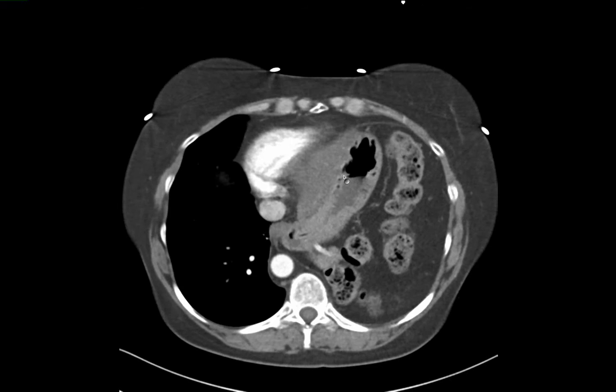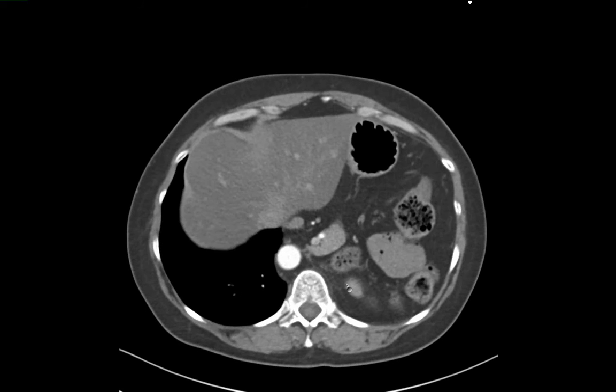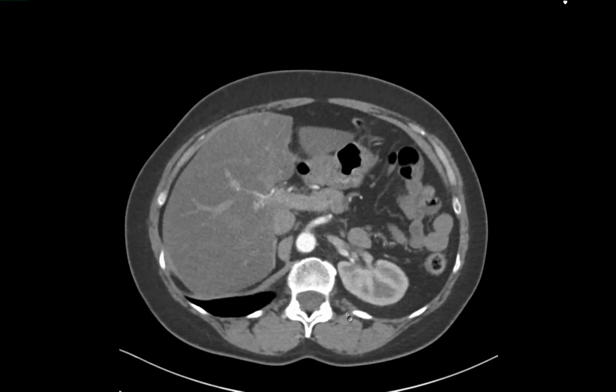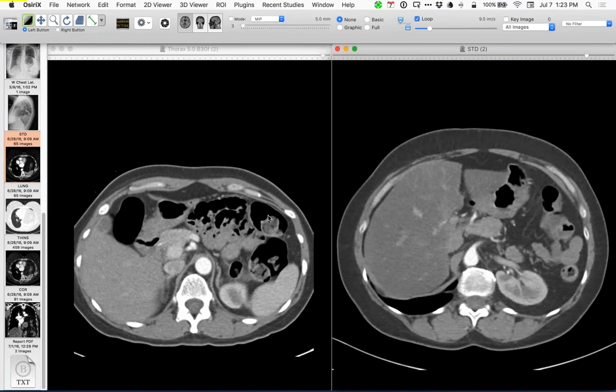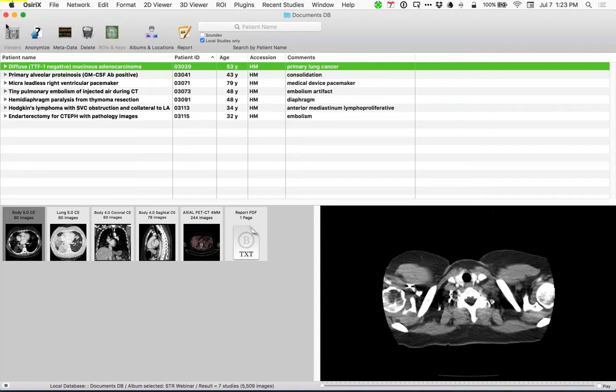Of course, the whole diaphragm is thin. One can see it here, going down to there, where the crus should be. Just super thin, inconspicuous. So another really nice example of that phenomenon. Absolutely. Now that I'm learning to look for that when I see a case like this, the crus is crucial. Yeah, learning that.